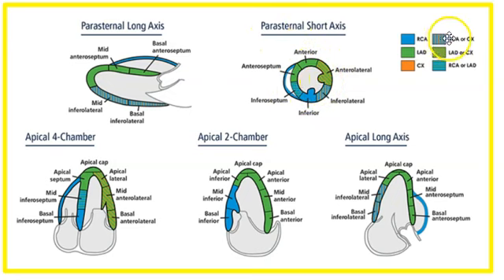And again, if we refer to our graph over here, we see green, LAD, primarily in the septal portion here. We have the septal portion. You can see it kind of changes down here a little bit. We go into the blue, RCA, and the inferior septum of the heart.